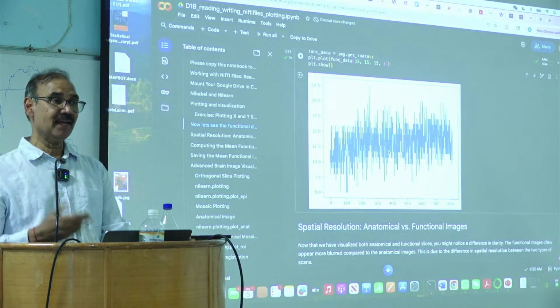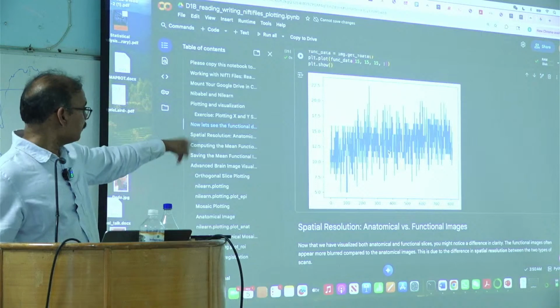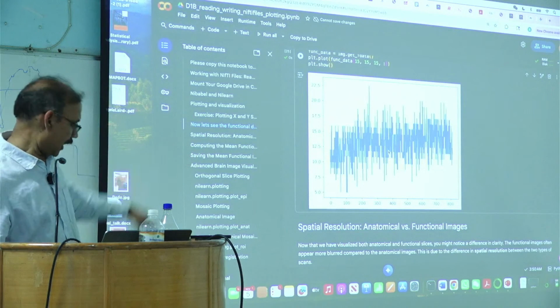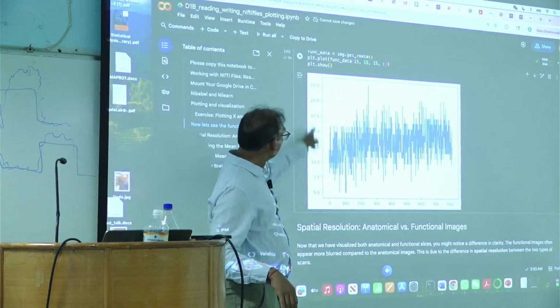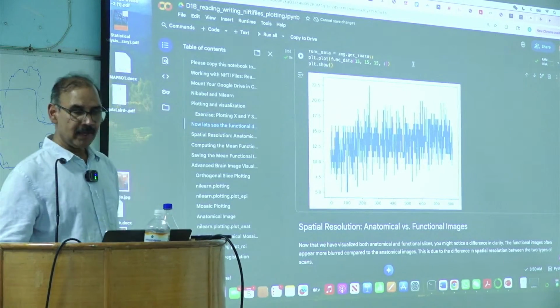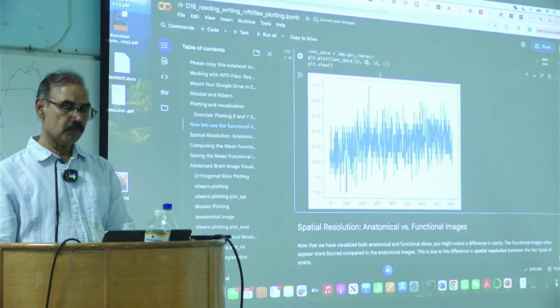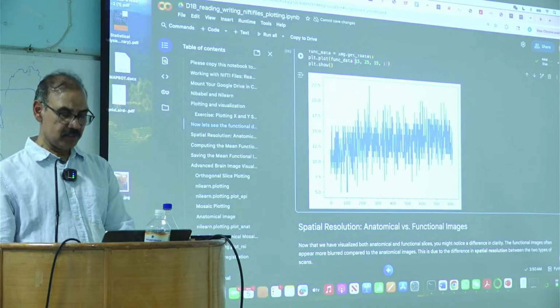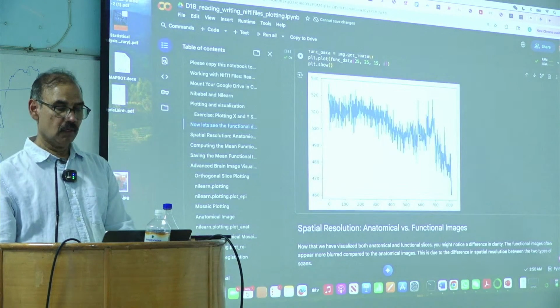This one, I would guess it's still outside the brain, right? Based on the intensity, the y-axis. See the y-axis, these values are between 5 and 25. If something is within the brain, the magnitude typically is much higher, right?